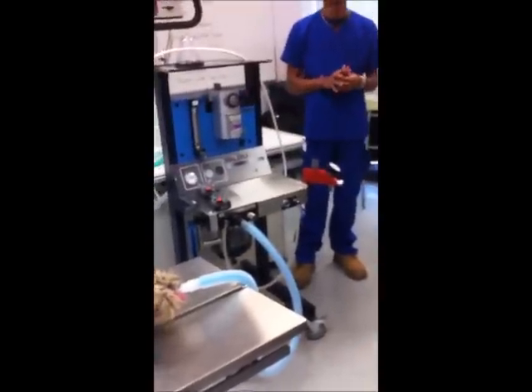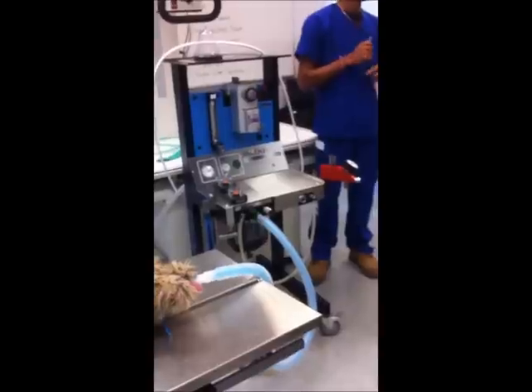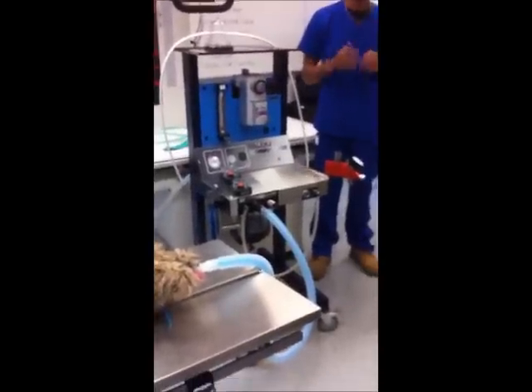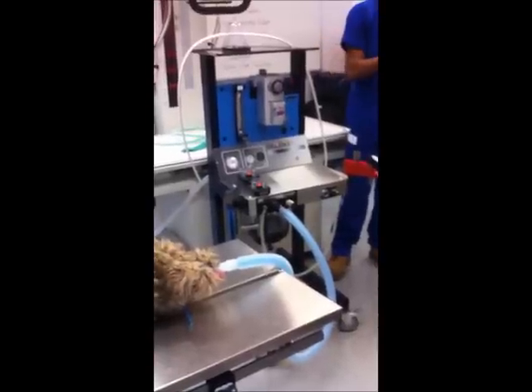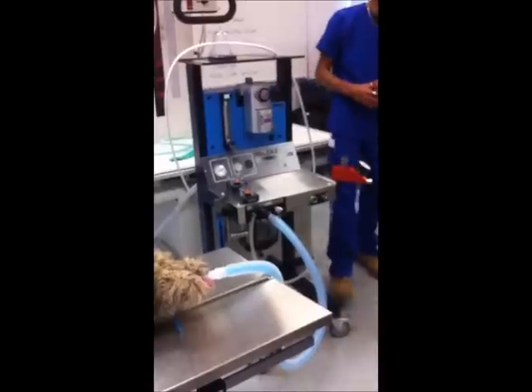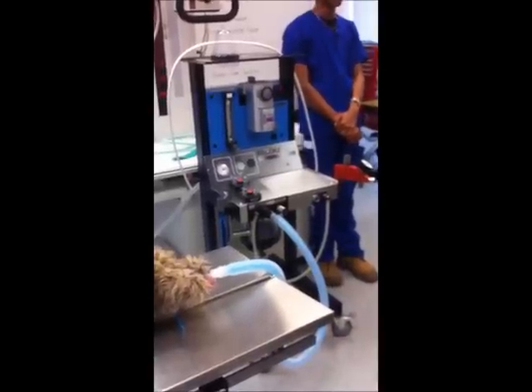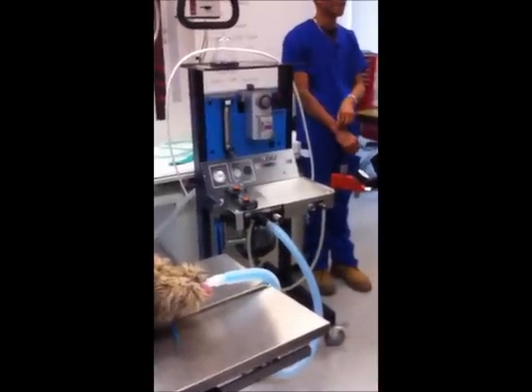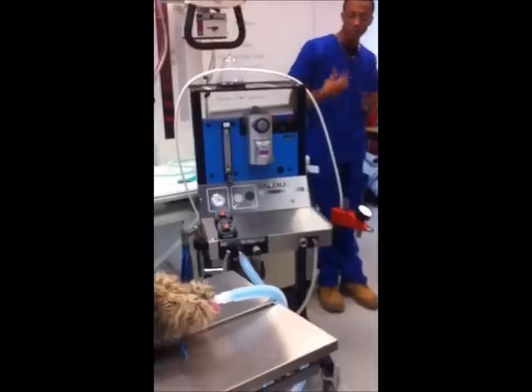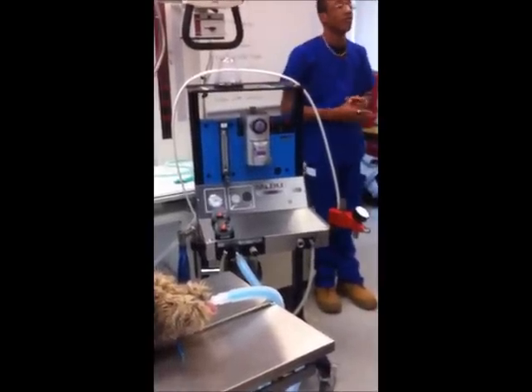And when is this used? When do we close the pop-off valve? No one remembers? Bagging an animal? Yeah? Super CPR? Don't write that on your test if it's asked. Okay, so after your pop-off valve, what's your next step? The scavenger. Okay, so you have your waste gas going out your pop-off valve, out to your scavenger, to the pigeons.